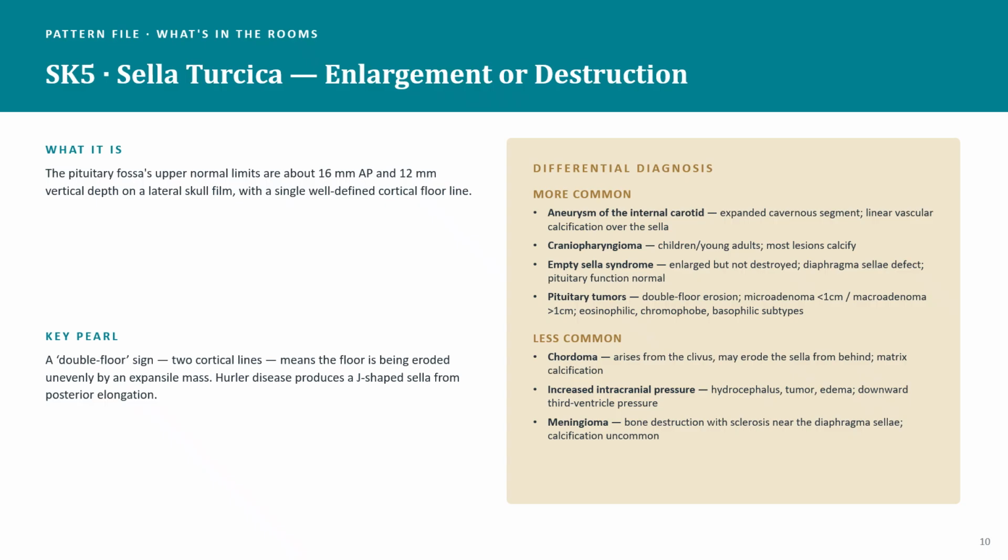Now, there are some other conditions that can cause the sella turcica to enlarge. One being maybe the patient has increased pressure on their skull, but again, the main thing here with the sella turcica is there will be some sort of change in the size, some sort of change in the shape, and then also they're looking at the floor of the sella turcica.